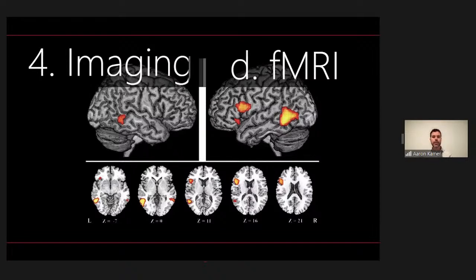So this example here I have obviously showing some language activation in Broca's area and a little bit in Wernicke area that are on the unexpected side of the brain, the less typical, less common side of the brain on the right. A patient like this who has epilepsy coming from the left temporal lobe would be much safer to ultimately do a procedure, do a temporal lobectomy, put a stimulator device in place on the left, because their language centers should be relatively spared in that context.